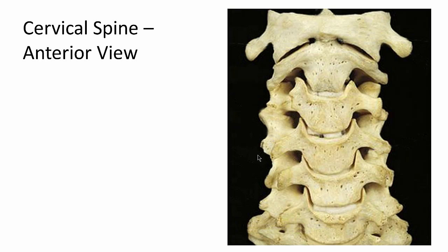Okay, let's jump into the anteriors here. Let you look at that for a minute to get your bearings. All right, let's go through it. So we have the transverse process of atlas. This is the lateral atlantoaxial joint right here and right here. The dens is behind, coming up like that. It's behind this structure, the anterior arch. Lateral masses of atlas are right here. Lateral masses of atlas, transverse process of atlas, transverse process of axis right here.